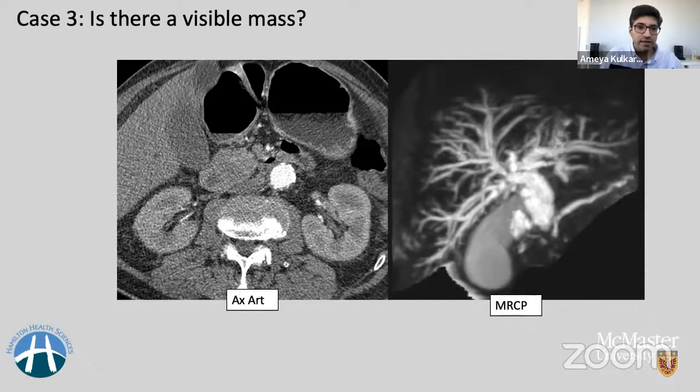head of the pancreas. So in this case, this is the area where the mass is present in the head of the pancreas. Again, it's going to be very hard on most occasions, but remember to have your pancreatic parenchymal phase. In this case, it was a little bit too early, and that makes it challenging to assess this lesion. So remember to use your phases. But this was the area of the tumor.